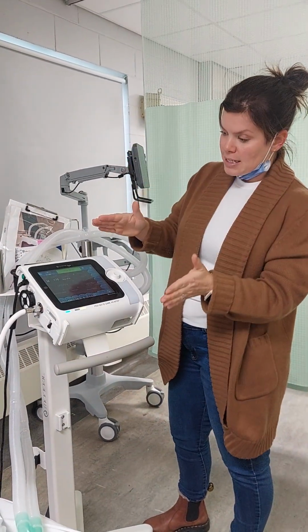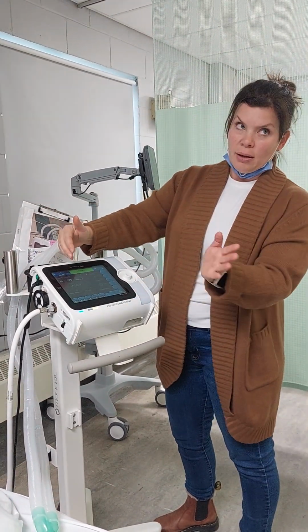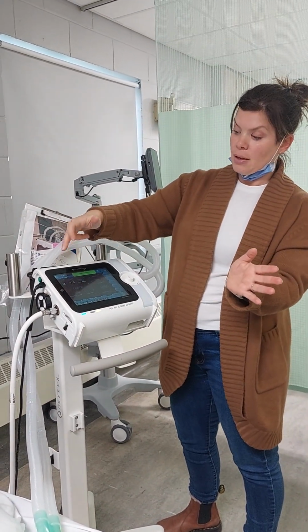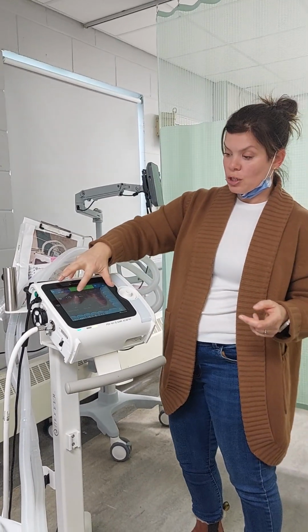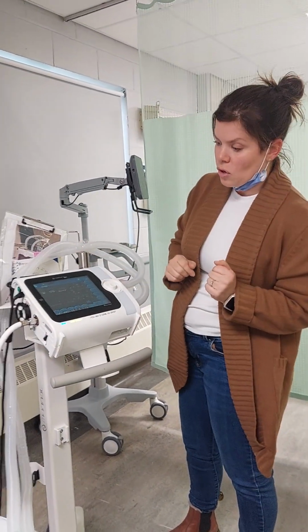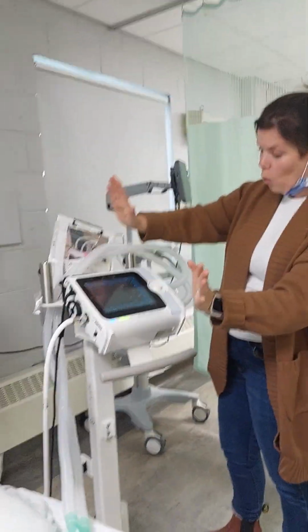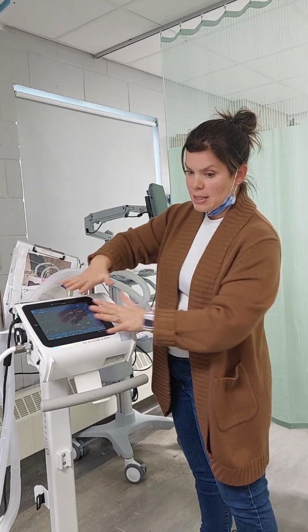So your biggest thing is when you're turning it on, you've intubated the patient, get your gender and your height, because it's going to do a calculation for lung size. And then you're just going to push the emergency button. Okay? That starts. It just goes. You can always change things from there too, so you're not committed. You have total power. Just as a quick overview.